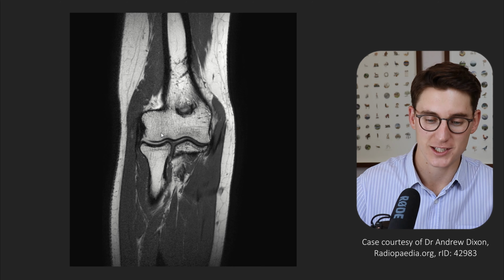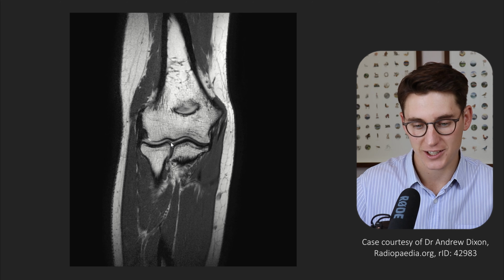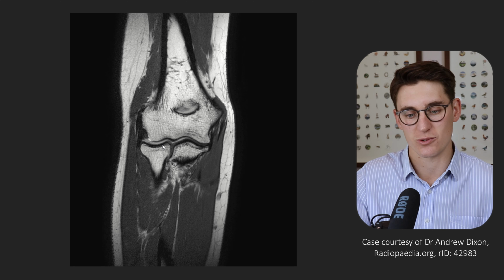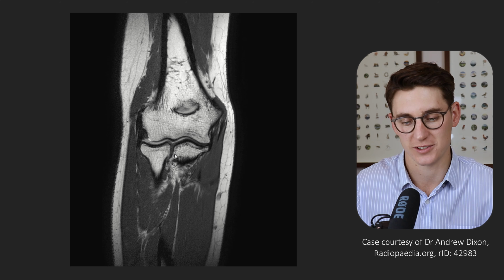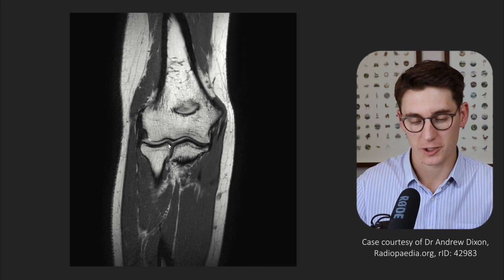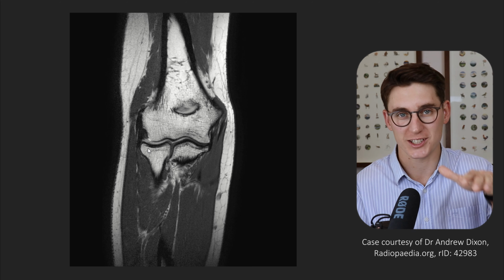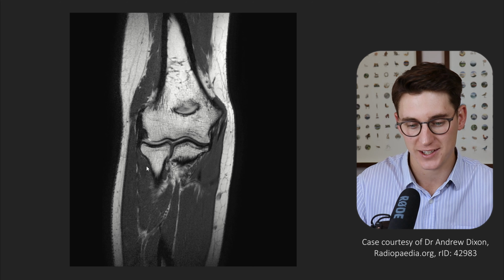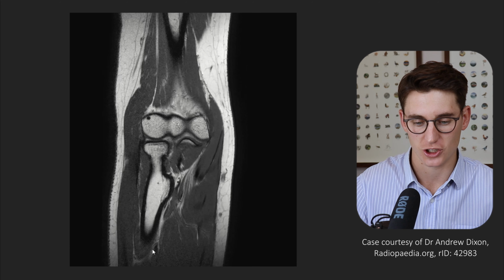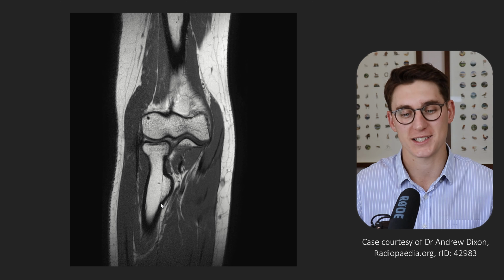So we have our radiocapitellar joint laterally, our ulnar-humeral joint medially, and our proximal radio-ulnar joint here, where that radius can rotate around in this pivot fashion and articulate with this proximal ulna here. So our radial bone can be separated into different sections. We have our radial head here, the part with the shallow fossa that articulates with that capitellum, our radial neck heading off towards our radial shaft, and we can see medially here this radial tuberosity where our biceps brachii tendon is going to attach.